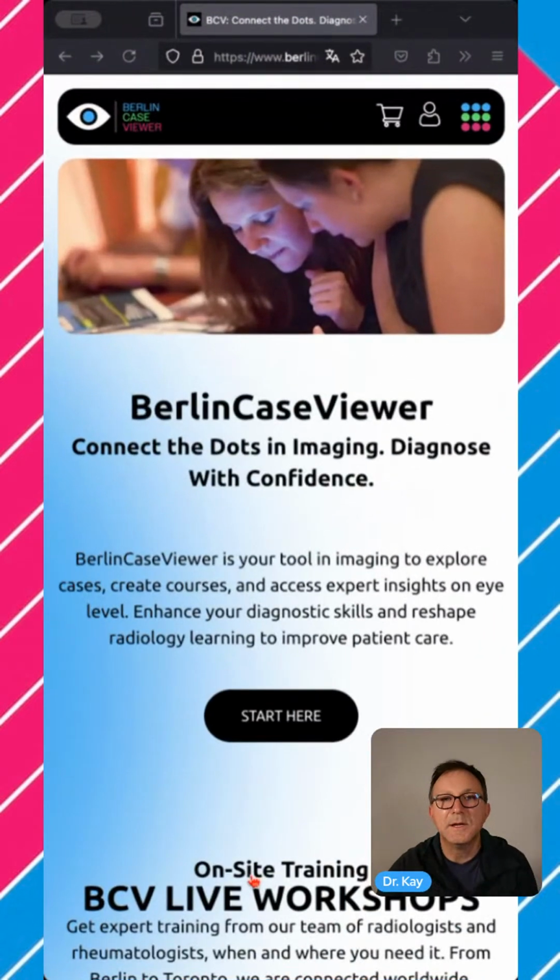So let me switch over to the mobile site, and I will present now the mobile browser that I have set up here. Let me see where it is. Yeah, we have it here. So that is our showing it now. Move from stage, add to stage, and that's how it is. Yeah, that's the page, how it looks on the mobile device.